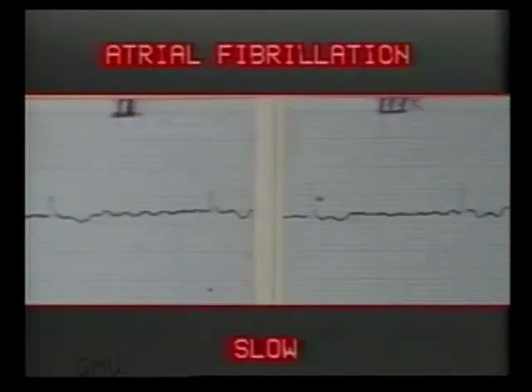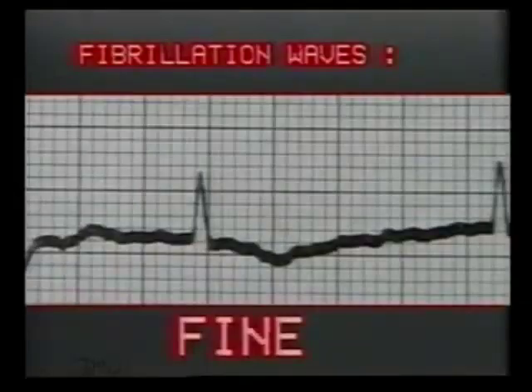In this ECG, the rate of QRS complexes is reduced after treatment with digitalis, but they occur at irregularly irregular intervals and fine fibrillation waves are seen. This is termed slow atrial fibrillation, an effect of digitalis treatment.